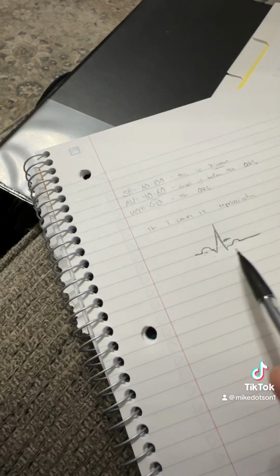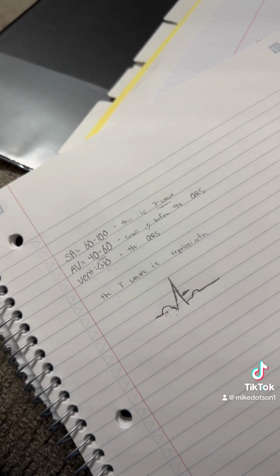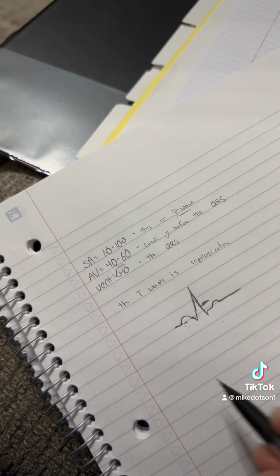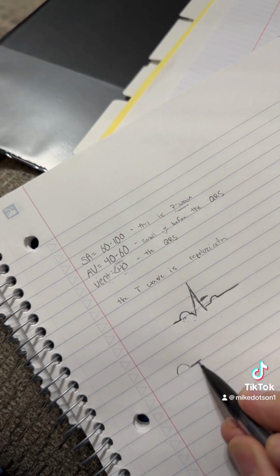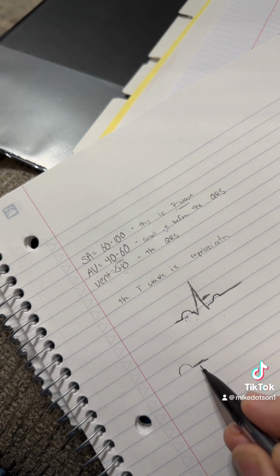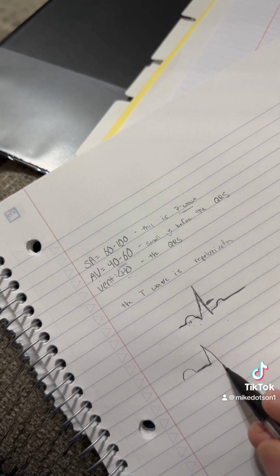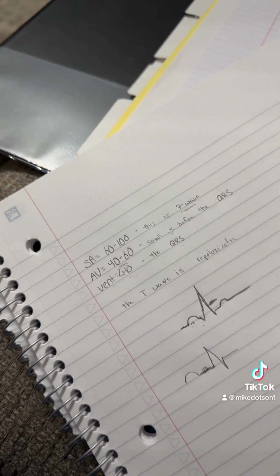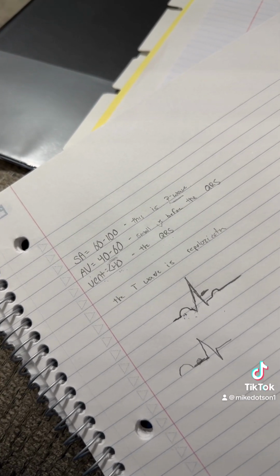Okay, so we just went over the normal sinus rhythm. Next rhythm you're going to be looking at is some that you'll see quite often, but there's no treatment for. That's a first degree heart block. It looks just the same as the regular. Only difference is this section right here, your PR interval is greater than 0.20. It's very common that you'll see this, but there's no treatment for it, and most people are walking around with no signs or symptoms from it. So when you see it, it's not much of a problem.